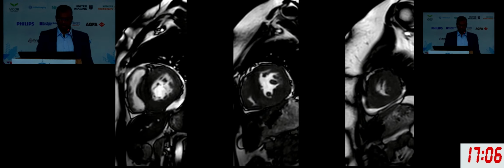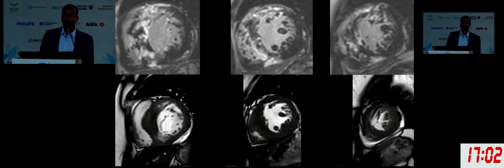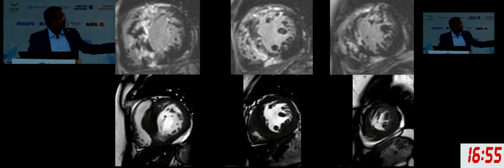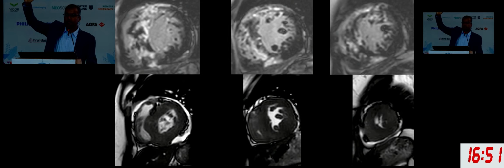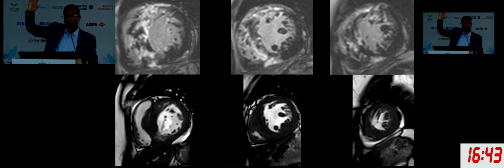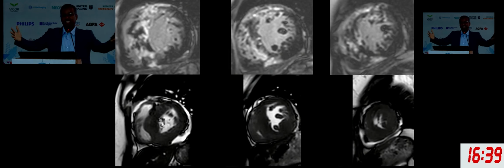We are okay that this is hypertrophic cardiomyopathy, and then you see this kind of enhancement, where you're seeing extensive enhancement along the septum, where almost half of the septum is not there. How many of you think this is HCM? How many of you think this is not HCM? How many of you don't know? Okay, the numbers have come down. So, okay, fine. This is HCM.